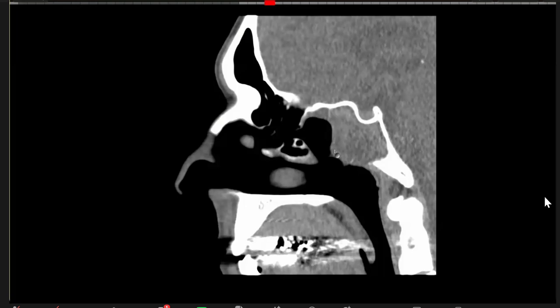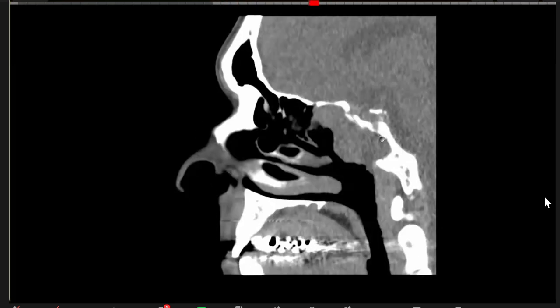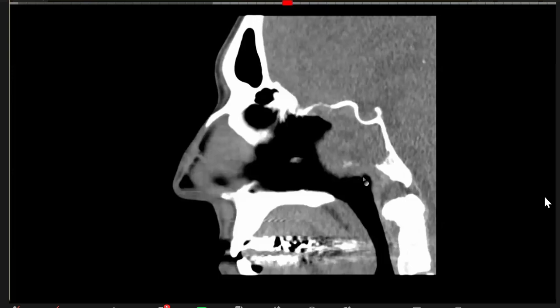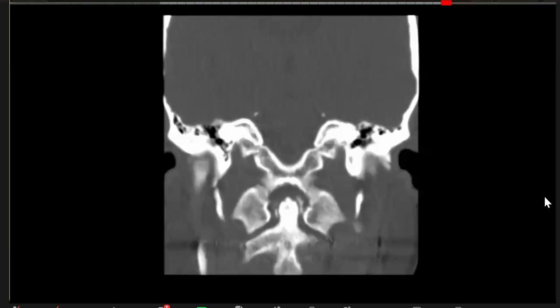It is completely eroding. This is the sphenoid sinus. There should be air sitting here. It is completely eroding. The epicenter is there. And this is the portion of clivus. So the basisphenoid portion is eroded. Basi-occiput is there. Of course, a portion of the tumor goes into the nasopharynx, but a portion of the nasopharynx is still preserved. This is the hard palate. So all of this is partially the nasopharynx. So the epicenter is in the sphenoid sinus.